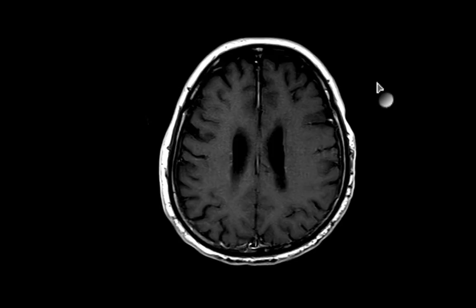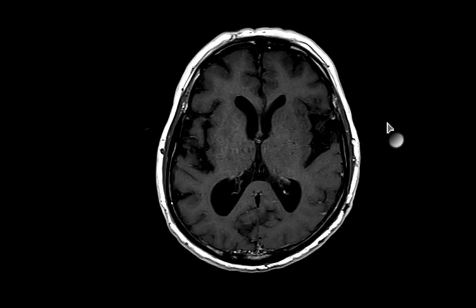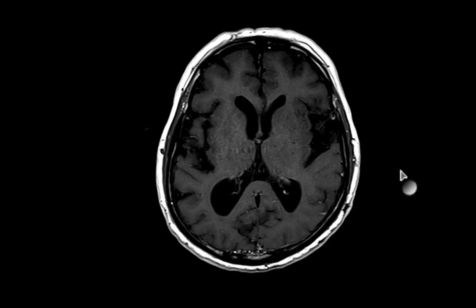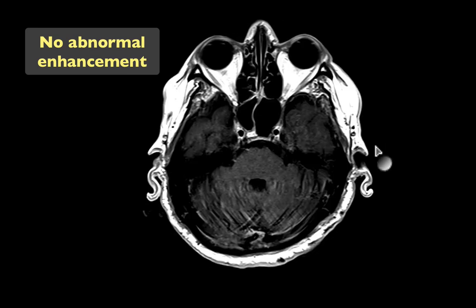Finally, to complete the case, this is a T1 sequence after administration of intravenous contrast to see if we have any abnormal enhancement in general. Since this is an infection, you need to check enhancement of the meninges, but also these infections may be associated with various patterns of enhancement in the involved regions, which we don't see here, so there is no abnormal enhancement in this case.